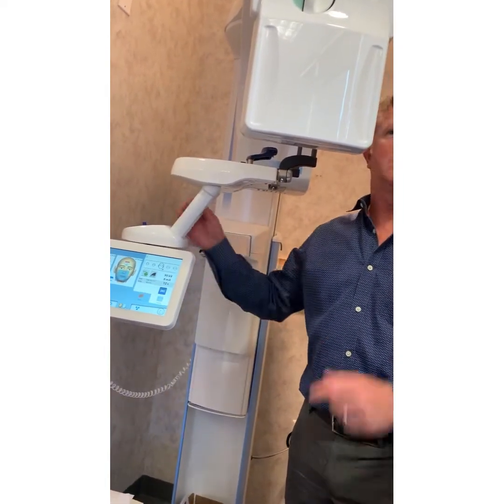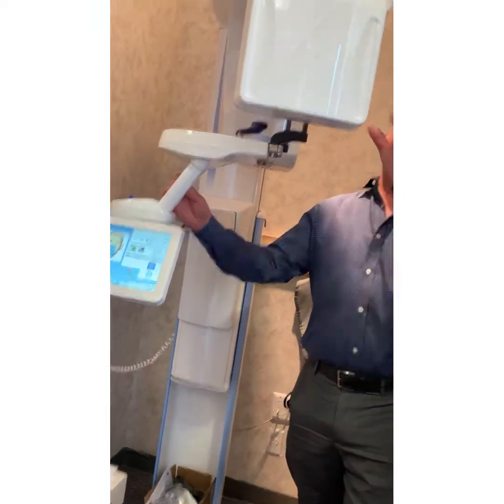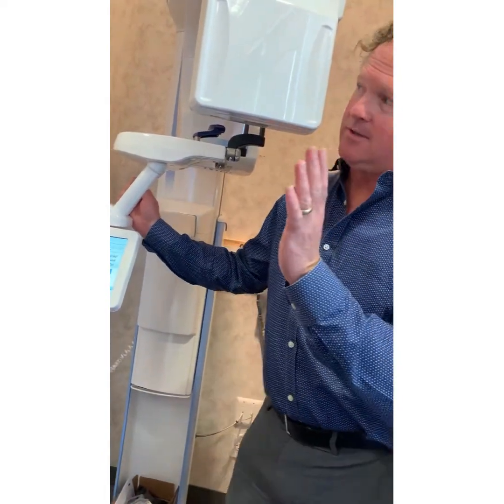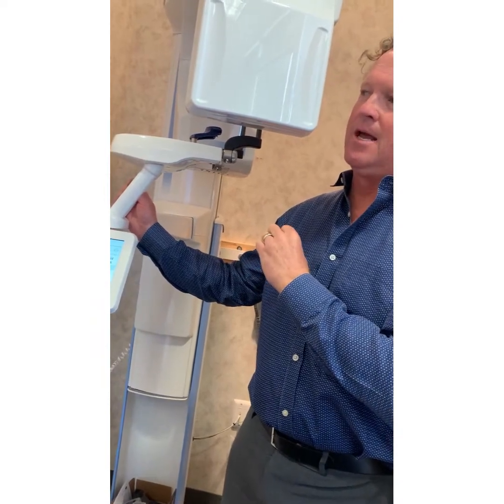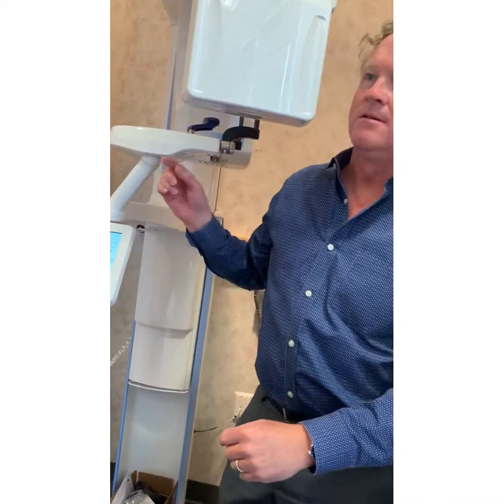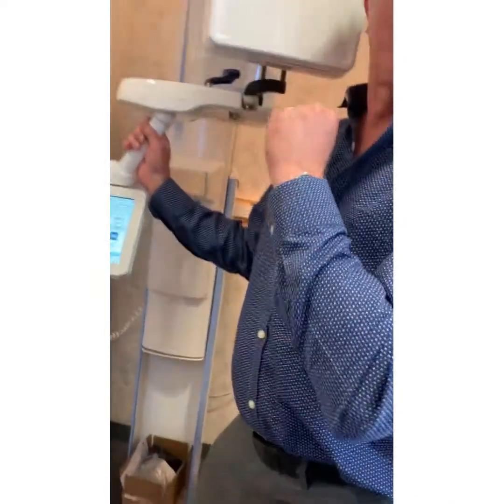Because the last part of calibration, this has to come back. So we're not going to be able to use it? Oh yeah, no, you can totally use it. We're fine. We're just going to move it. I'm concerned about that. And so from me to him, I'm going to say it's going to be recommended. And I need to talk to him about the buttons too. And there's no reason why this thing shouldn't be somewhere else where you guys aren't standing here. Or even right here. It'd be totally fine right there. I think the tough part was running the wiring.